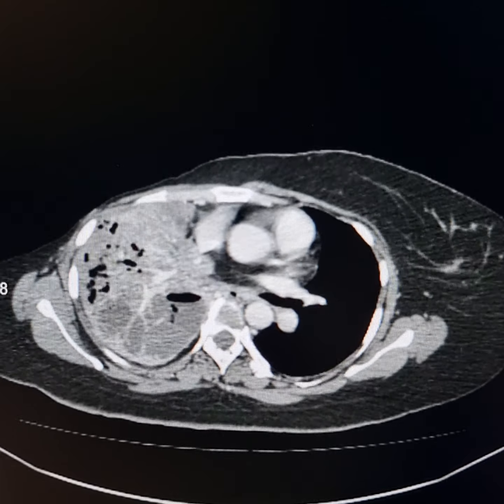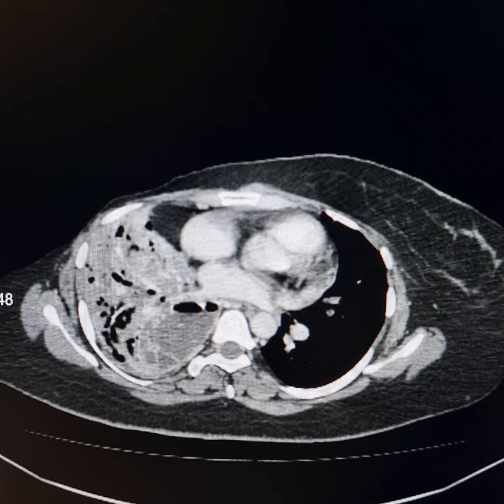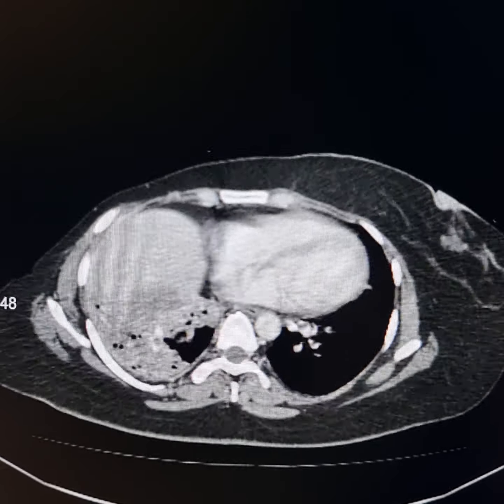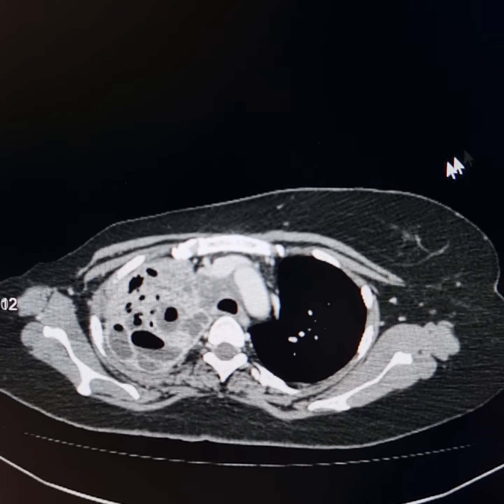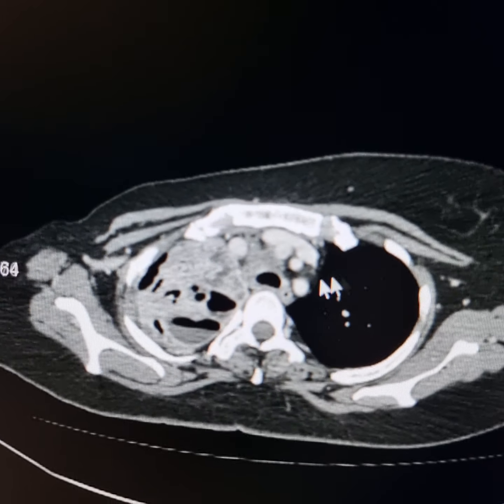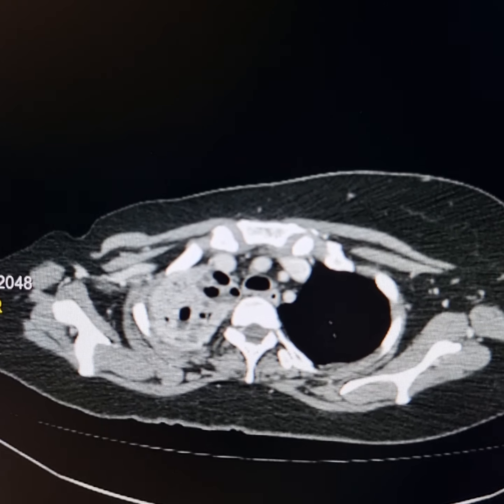And now there is reactivation, and there is a metastatic spread of the disease process into the right lung. And please observe the mediastinal lymphadenopathy here. This one is the mediastinal lymphadenopathy lying anterior to the trachea. This is typical of metastatic disease.